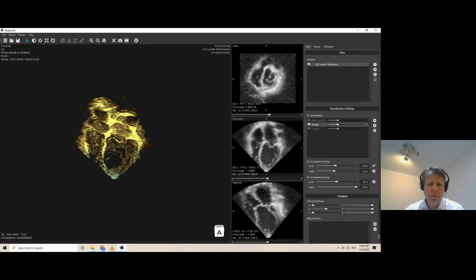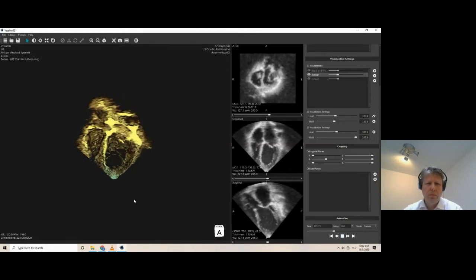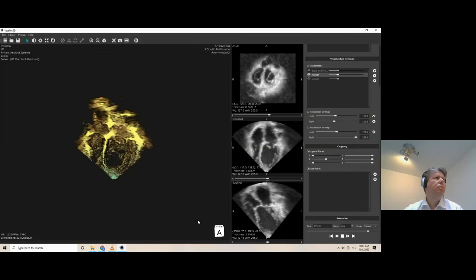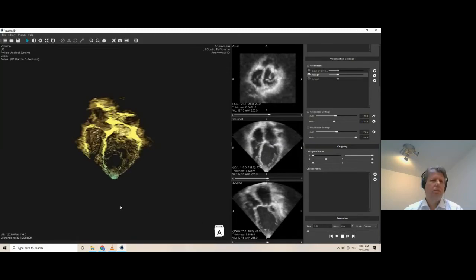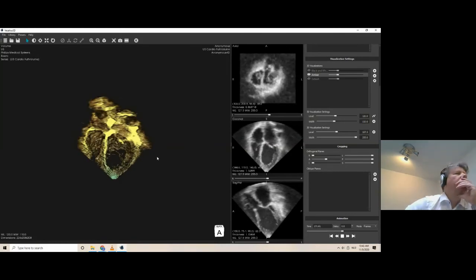And the way we want to show it, as Mark explained, is that we also want to give you more of the structural information. This is a nice data set because it's not only 3D, but it's also 4D. And I'll try to get it pulsating. My machine is a little bit slow, especially for a data set that's not that big. But it's opening. Oh, it's really slow, Mark. So now it starts pulsating. So you can see the pulsating over here. And on the right-hand side, you still have your dynamic images, which you're used to in 2D.